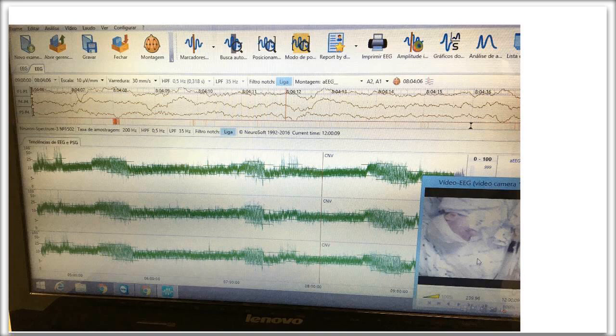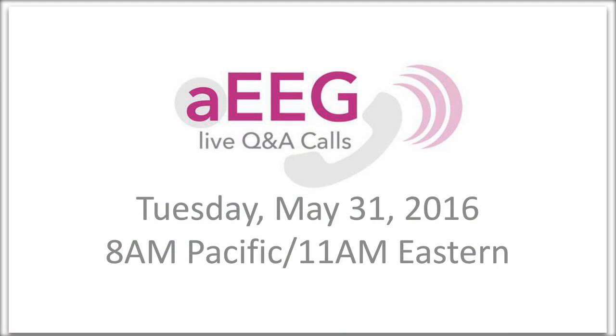And then the second tracing is a great example of how, as infants are a little bit older, sometimes we see the tracings be a little higher, but we're again looking at the overall pattern and seeing this nice narrowing and thickness, maybe not to the degree that we're used to, but certainly seeing it in a nice one per hour, which is always a really good sign that I look for sleep-wake patterns. So some great traces.